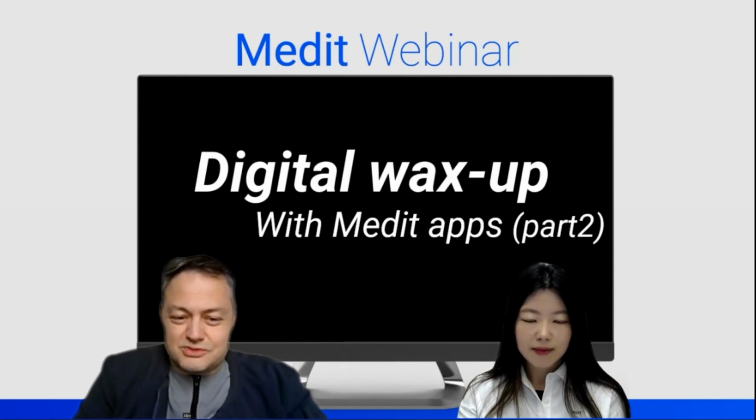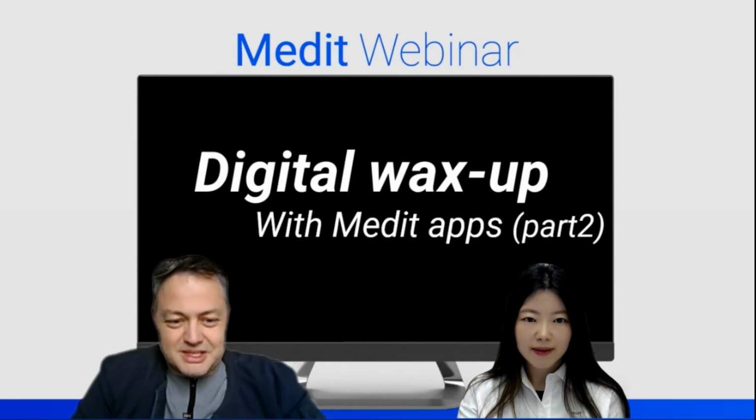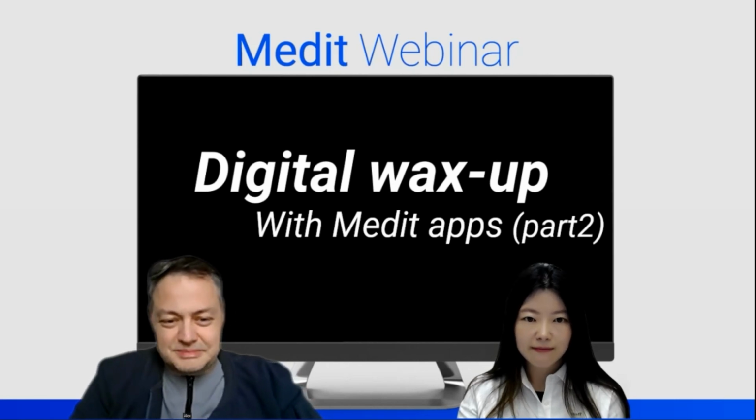This piece of software is actually my favorite of all software that Medit offers. It's been so for many years, and I find anything I need there, from positioning tools to manipulating tools for meshes to Boolean functions to combine. So everything is there. It's an amazing piece of software that I am going to try to explain to everybody to be able to actually use better and get proper results.